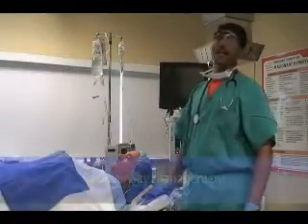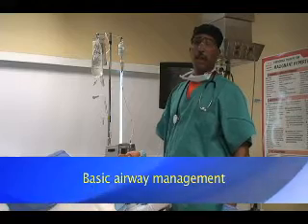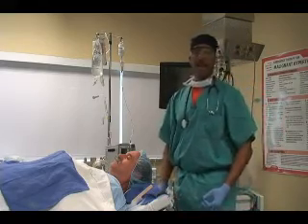Hello. In this vignette, we'll be talking about basic airway management. I'll cover head position, correct application of the mask, correct head placement, ventilation, and managing an obstructed airway.